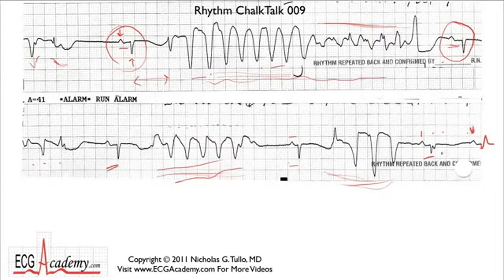Anyway, so we've got a sinus bradycardia, or barely a sinus rhythm, but then we have these wide complex tachycardias. So when we're figuring out where a wide complex tachycardia comes from, what should we be looking for? Well, how does it start? Is there a P wave in front of the first beat? Because that's a really important clue. If you see a P wave with a normal or a slightly prolonged PR interval, then it's most likely atrial, and you start to think about Cardizem for some kind of atrial arrhythmia with aberrant conduction.